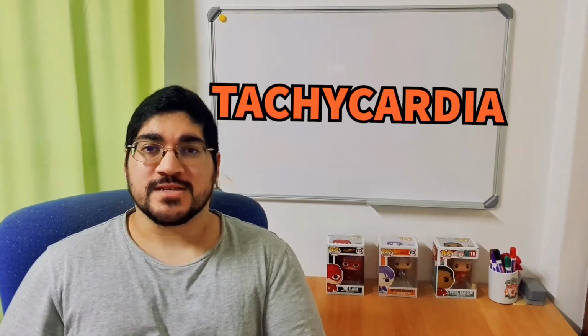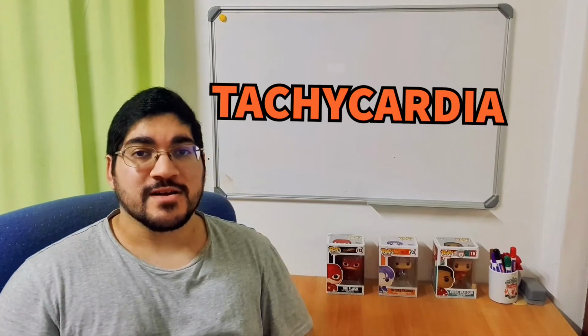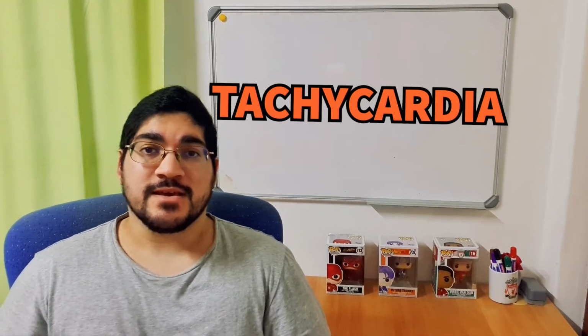Today is episode 4 of our series, How to Interpret a 12-lead ECG, where we're talking about tachycardias. Last time we spoke about the PR interval and how that can cause bradycardias like heart block, so today we're talking about tachycardias in preparation for our next episode on the QRS complex. So what is a tachycardia? Tachycardia is just any heartbeat over 100 beats per minute.